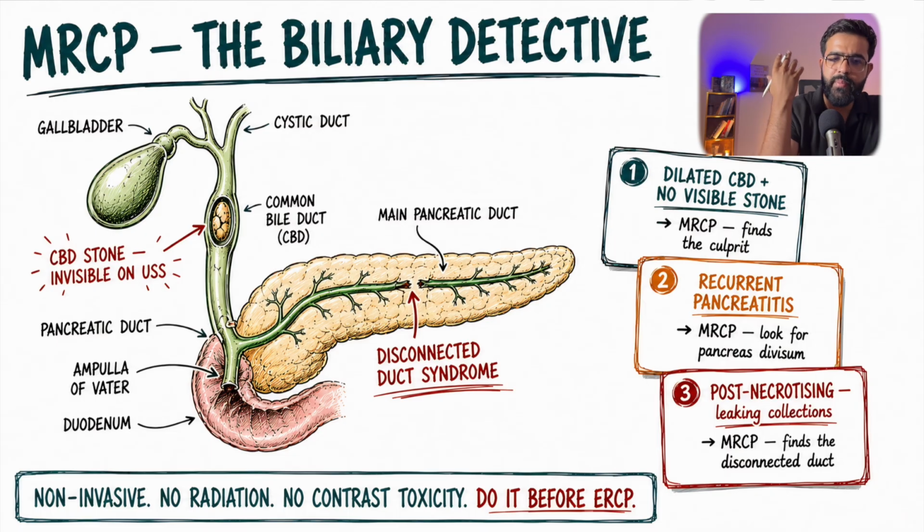For example, the patient had pancreatitis 6 months ago. Follow-up CT shows a cystic lesion in the pancreatic tail. Is it pseudocyst? A serous cystadenoma? The CT struggles with this, but MRI finds the answer very well.